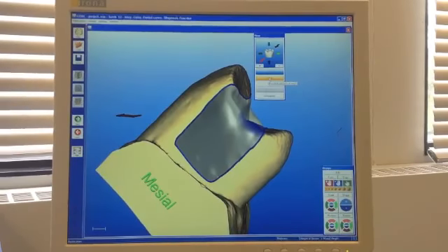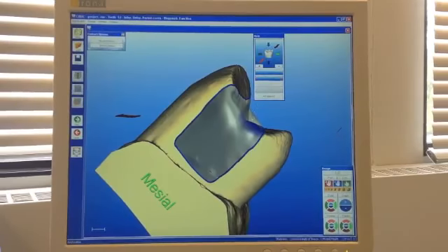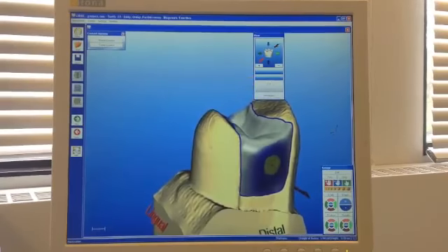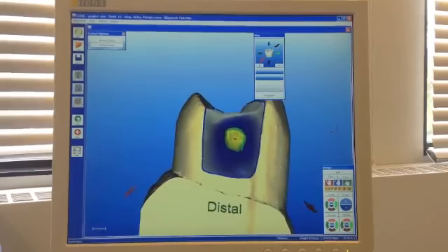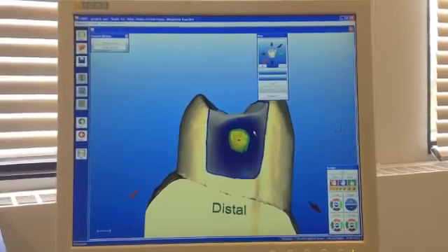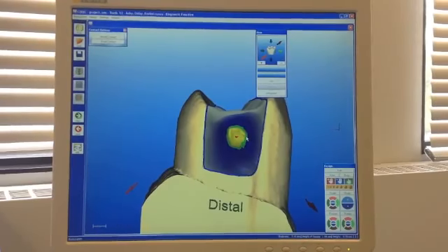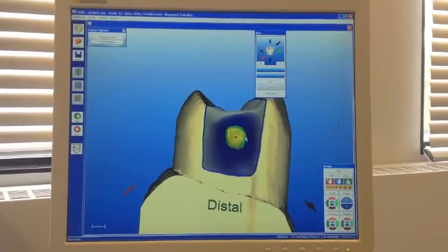The second key here is contact. So now you're going to check the contact strength for mesial and distal. Remember, for this particular model here, we only have the distal adjacent tooth. And you can see that we have different colors for this proximal area. This blue color here means we almost have contact, but it's not touching. Green means you are touching, but it's less than 25 microns contact area.